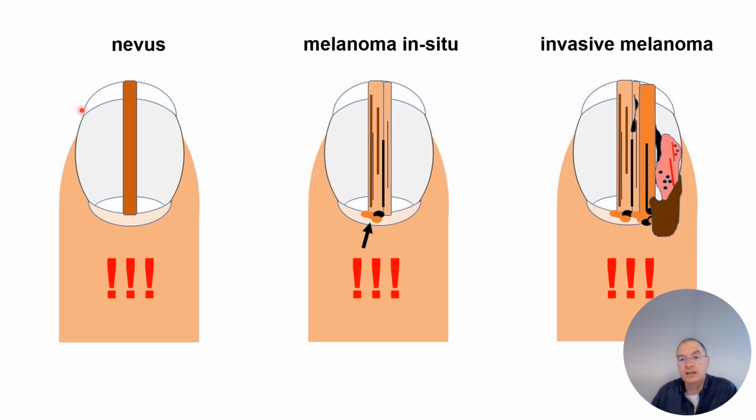The left lesion in this schematic figure shows homogeneous brown small pigmentation. This is fine, nevus, okay? But here we start to have a kind of barcode, like I say. It's a different type of lines, different sizes, different colors, something is different.